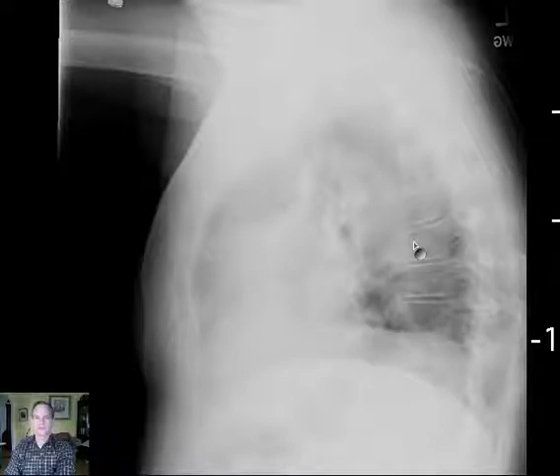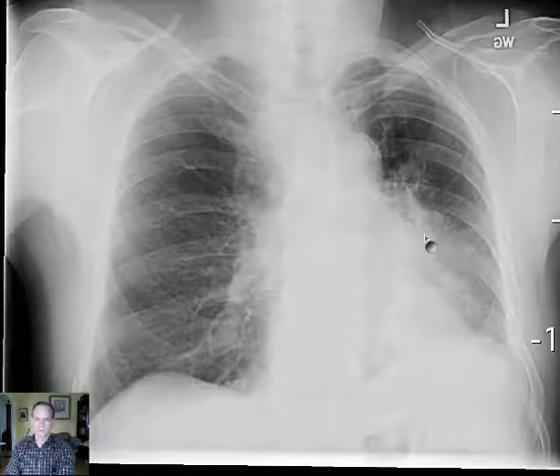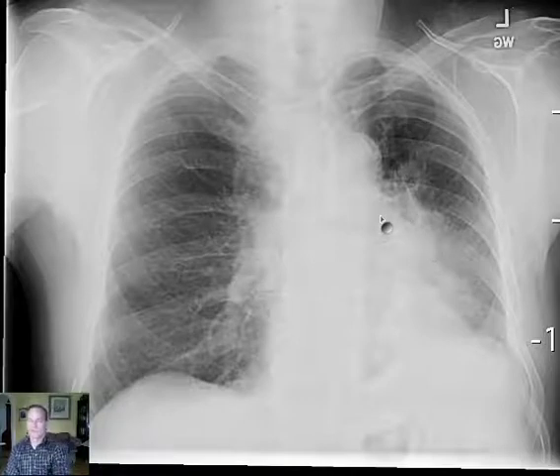Okay, so you have an 81-year-old male with volume loss in the left lung. Whether all of this opacity is volume loss or to some extent a tumor is hard to tell. Could be pneumonia. Could there be a pneumonia with a bronchus plug obscuring or occluding the left main stem bronchus? Possible.